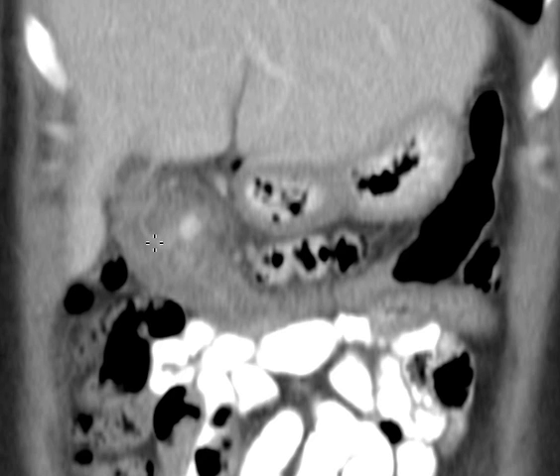This is where the colon lumen should be. So there's edema, probably related to some type of inflammation, and we have this little pocket of contrast, and that's oral contrast. How can we put those together?